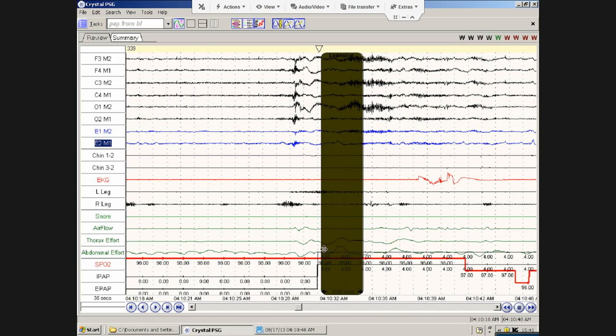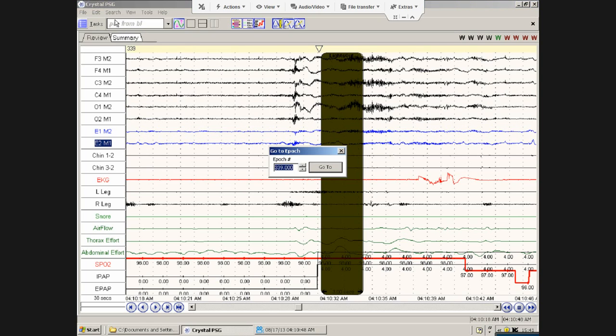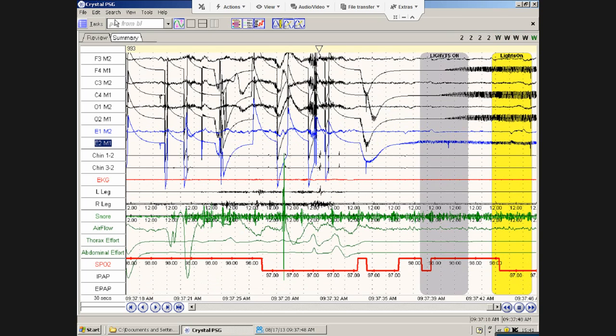I like to have only PAP within this report, no zeros, because it'll report like half a second of zero, and it's just annoying. I'm just compulsive that way. Anyway, now we have this lights out, and then if we go to 993, that's where our lights on is, you'll remember. And so now we're ready to make the therapeutic portion of the report.